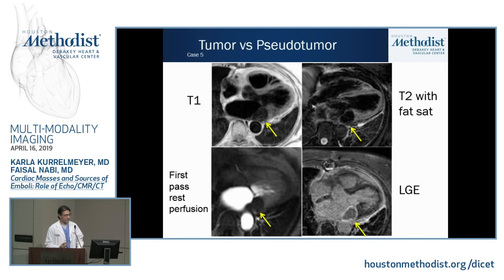And then finally, on the LGE, it actually gives this very pathognomonic, classic look to it, where the center is dark and you have this rim of fibrosis or delayed hyperenhancement around this mass. Now, you're probably absolutely right, you didn't need to get to the stage of a CMR to make this diagnosis, but if they do make it to the CMR lab, a structure that stays dark in all your sequences is calcium. We image protons, we don't image calcium. So calcium will stay dark in all of our sequences.